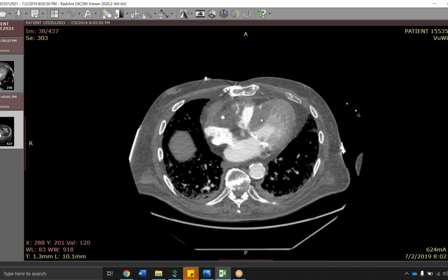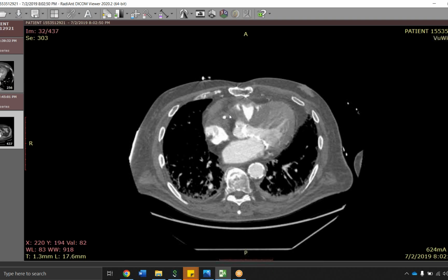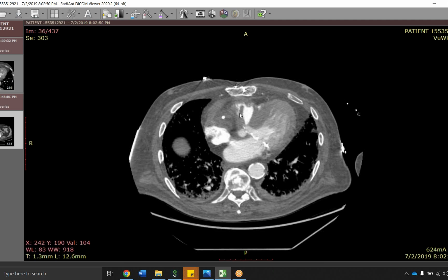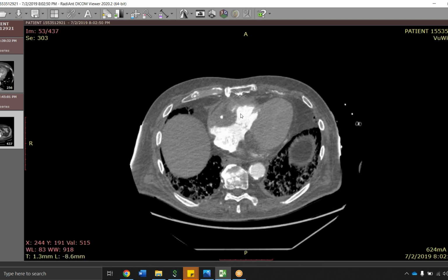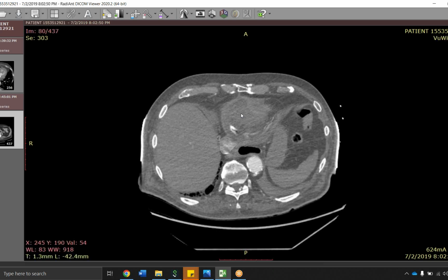And so was it just a stent that led to this? So I think the entire RCA was occluded before they started. And so they were essentially dissecting down to create a tunnel, and then they put a stent over what they had created. So there's probably some leaking, or some bleeding out in that.